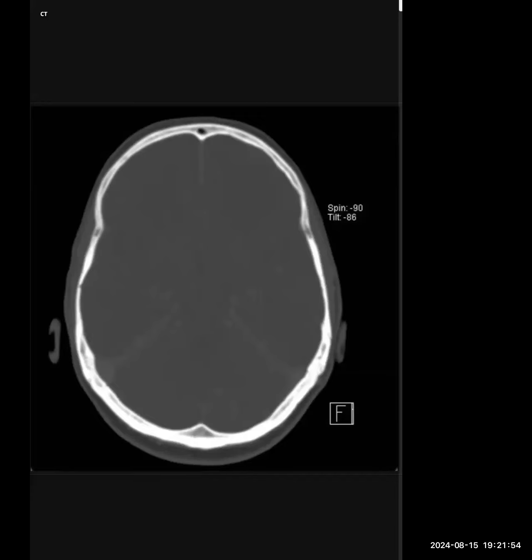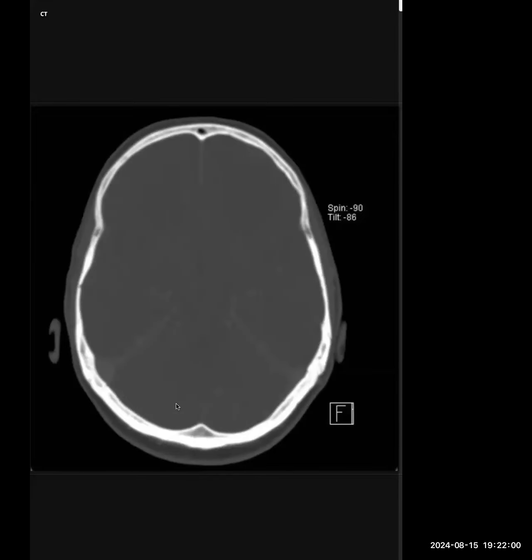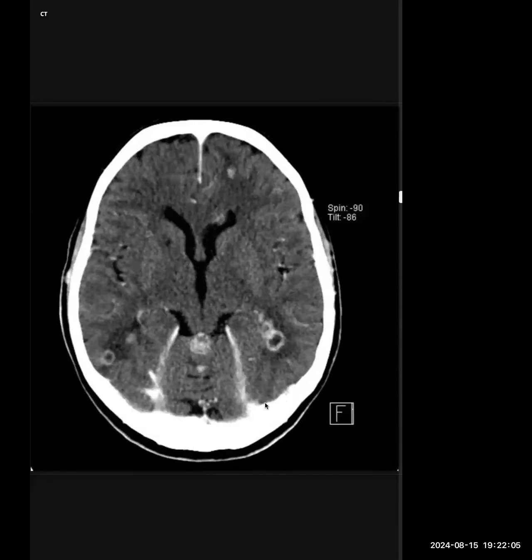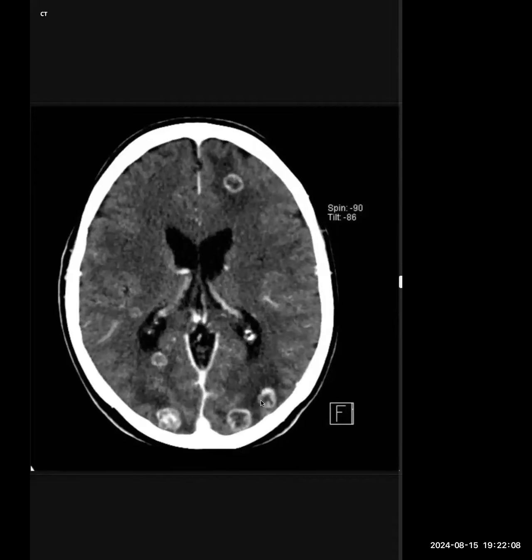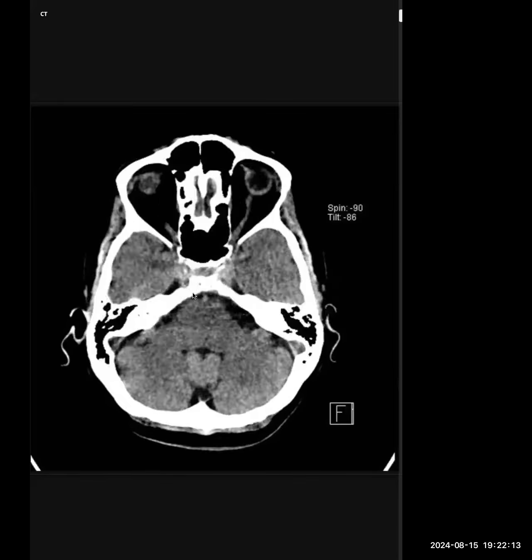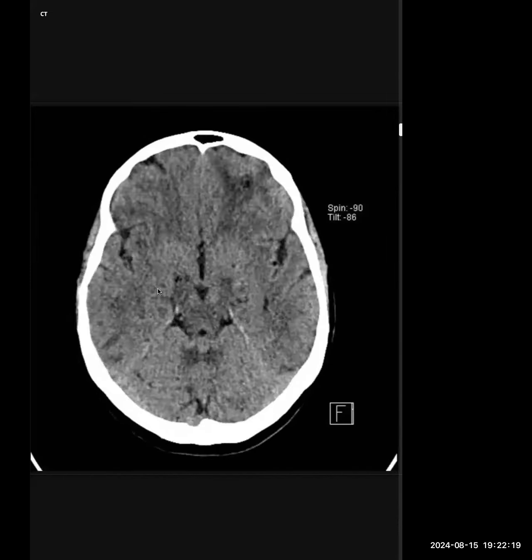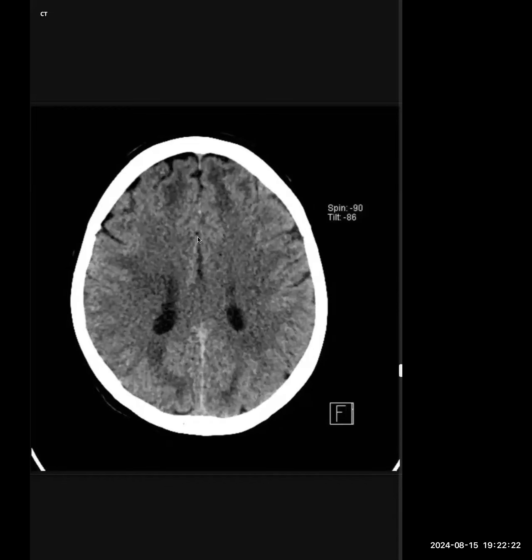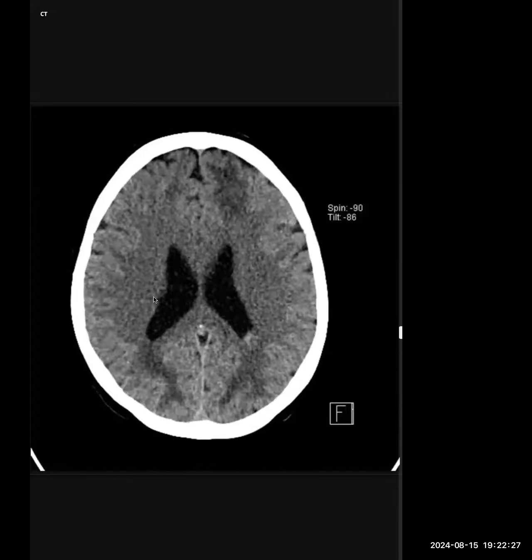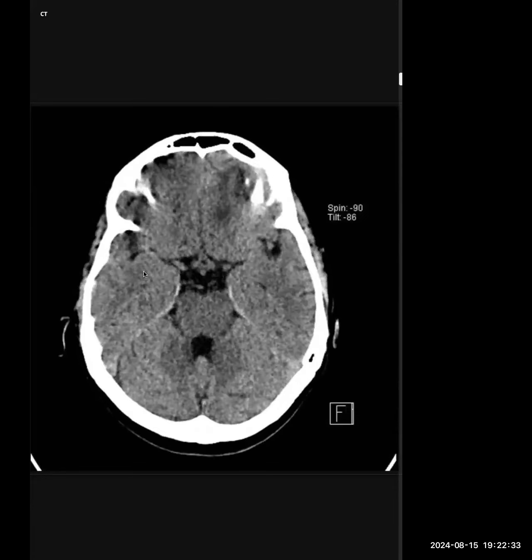Okay, thank you. So differentials would be hemorrhagic metastasis or cavernoma on the non-contrast. After you see this, though, I wouldn't really place a lot of importance on cavernoma. But that would be cavernoma and some hemorrhagic metastasis or calcified primary brain. Hemorrhagic metastasis would be the primary, because what else would cause a hemorrhage like this, right? With multifocal hypodensities everywhere. Without the hemorrhage, I would think about infection, maybe tuberculosis, but with the hemorrhage, I doubt it's anything else. Yes. Thank you, Dr. Dev. Sure.